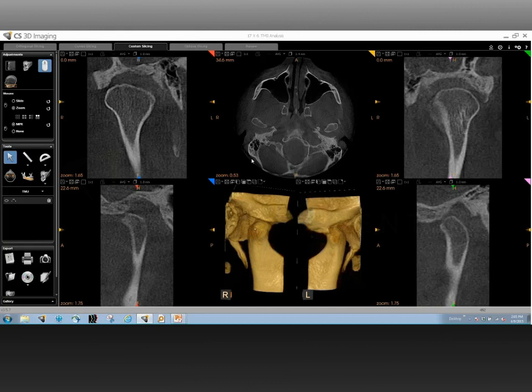See, Jordan, one of the biggest advantages of having bilateral anatomy on a single screen is that you're able to compare and contrast both the condyles of the same individual at the same time. And that is very essential when you evaluate a joint that is not a single joint, but actually a dual joint, so to speak. So one of the few things that you can look for, apart from the anatomical landmarks, is the smoothness of the surfaces of the condyle and of the fossa. Now, you can see the cortical bone over here. It thins out on the superior head, maybe superior medially, indicating some sort of degenerative change.